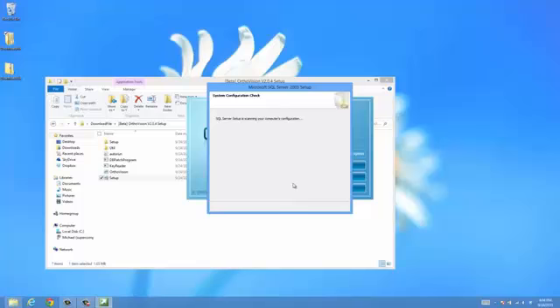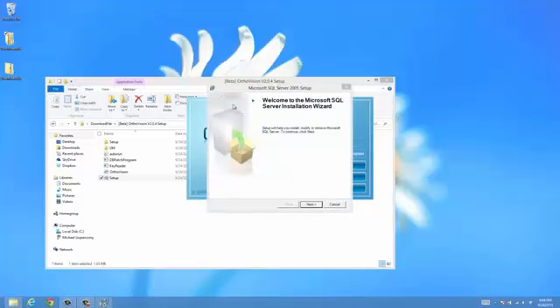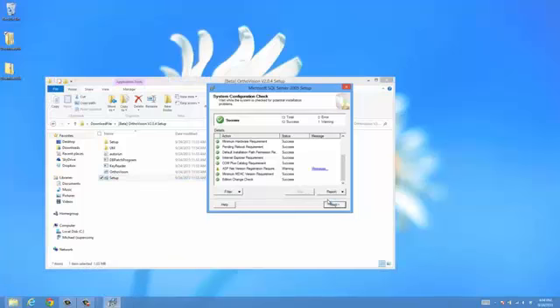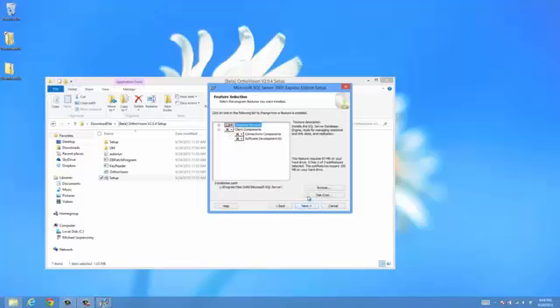So after a brief system configuration check, you'll see a new dialog come up shortly, which will start off with yet another systems configuration check. Basically, you can continue to click Next and follow the standard setup procedure up to a particular point. You can fill out your company and your name here. And this is particularly where you need to change something.